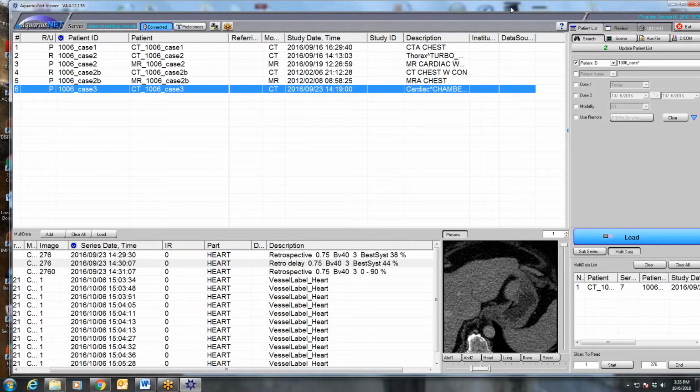Oh, wow. And he's too old for Takayasu. He had some negative serology that's pretty good at excluding giant cell arteritis. And he's got a lot of lymphadenopathy in his mediastinum and hila that looks just like sarcoid. Anytime you saw that lymphadenopathy, you'd say this is sarcoid. And I'm just wondering if you've ever seen sarcoid arteritis, aortitis. I have not.